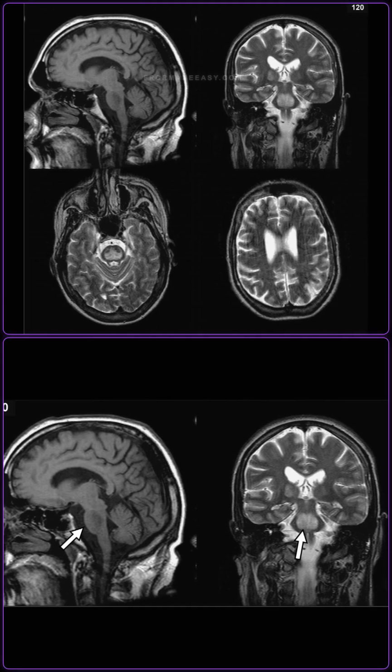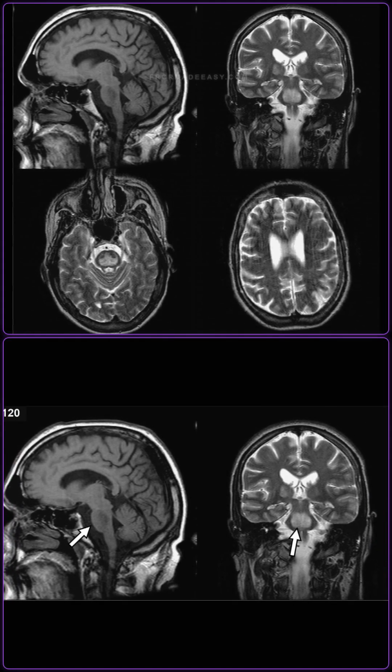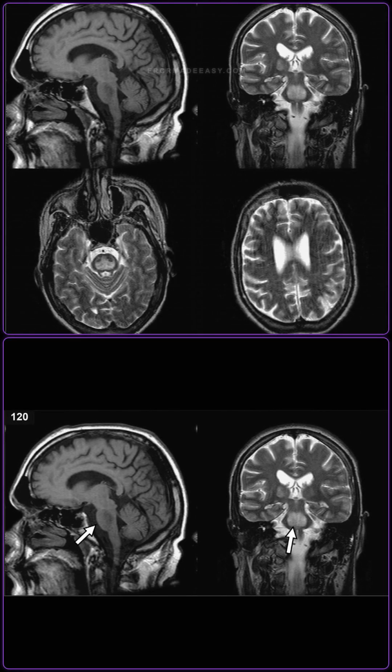I'm showing you a magnified view of the pons. What is the diagnosis and what is the differential? The diagnosis is central pontine myelinolysis, also referred to as osmotic demyelination syndrome.